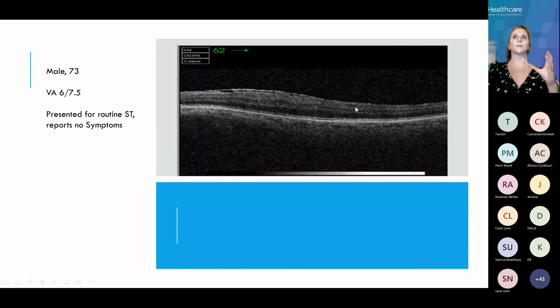the first things I talked about, which was scan quality and trying to get what's happening in their normal scan profile, we've taken this image off center. So we've got the patient to move their fixation and we've taken it slightly more peripheral. So here, as we've all put, on the top we have an epiretinal membrane. Patient's vision isn't affected. It's not looking at the central macular area, and the ELM, photoreceptors, RPE, all intact in the sections that we can see.